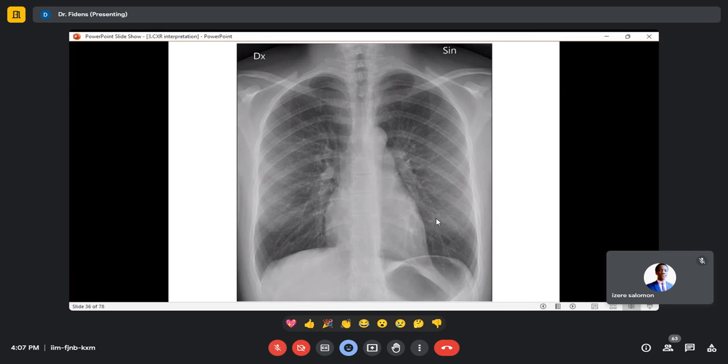Like the diaphragm, you should understand how it is. I told you many times that the lower part of the lung goes deeper posteriorly. So the part you see there, it is lung. The lung posteriorly. The reason why you don't see it here is because there is a solid organ, the liver.